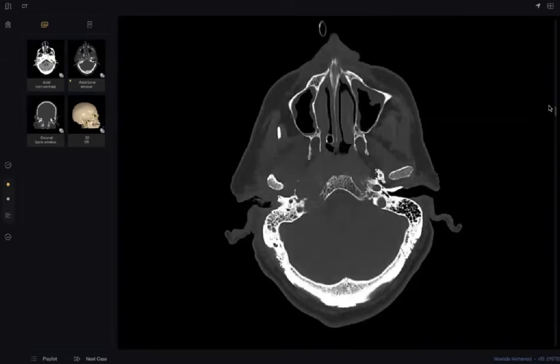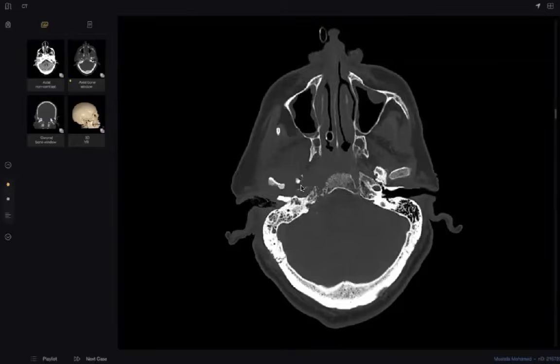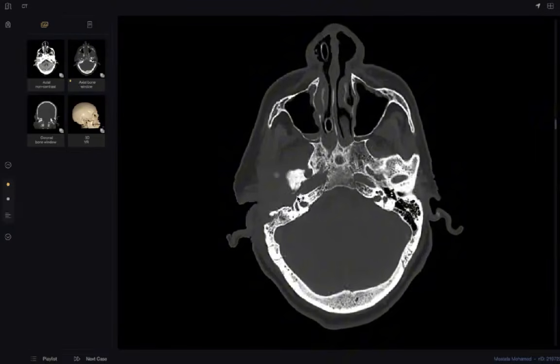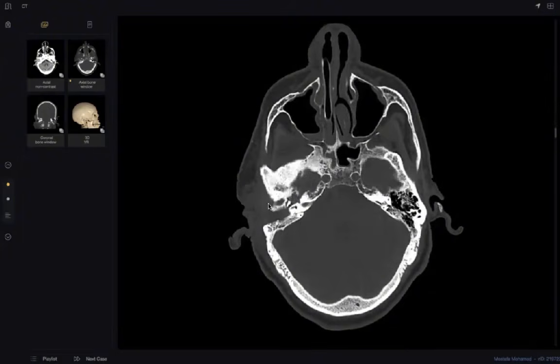So I will show you the normal anatomy after the next case. What happened here? There is destruction here. This is the clivus, the petroclival region, destructed, and this whole area. Look at the other side and start to describe what happened here. This is the carotid canal. Almost erosion of the carotid canal here. And this is very, very dangerous. And what else? Sclerosis of this bone.